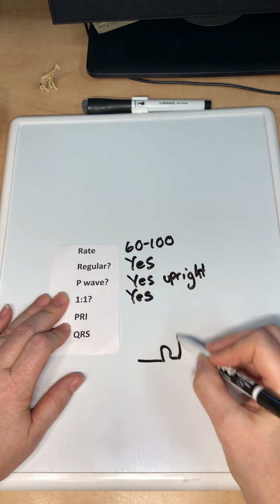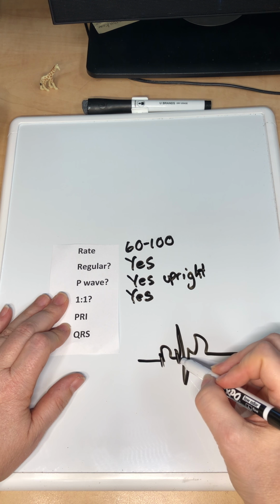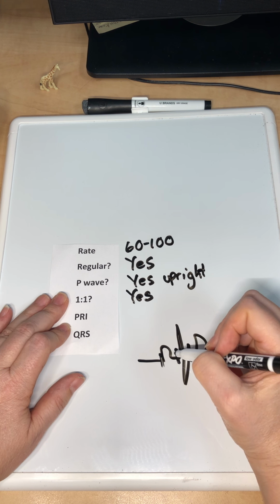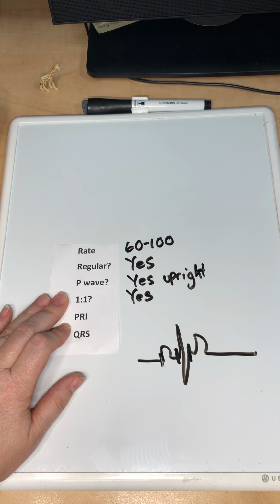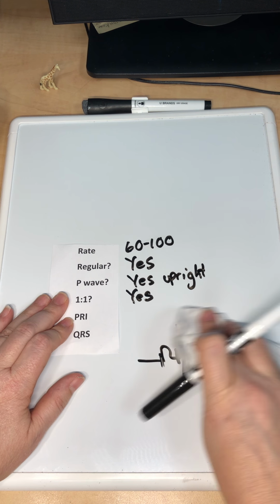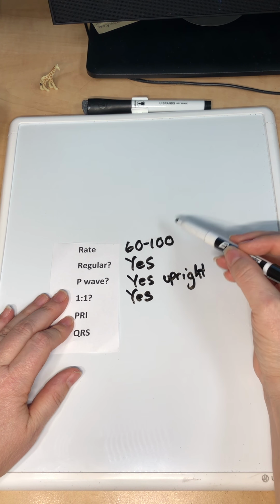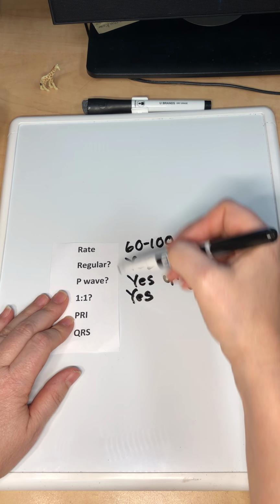On the EKG, you're measuring the interval from the P to the R, and the QRS is from here to here. When you measure these, they need to be within certain limits, but we talk about that in the full course. So I don't need you to be too concerned about this right here, because that's too much detail for our purposes. But this would be an ideal circumstance.